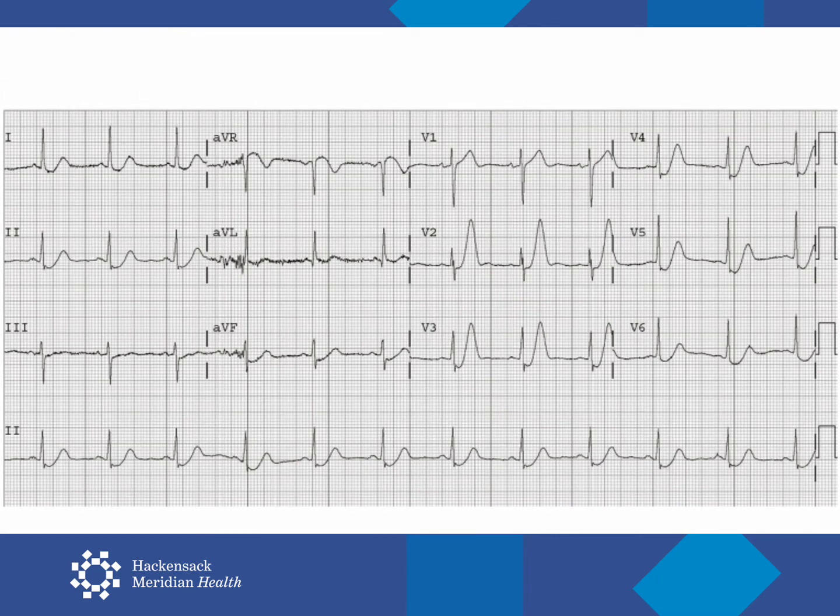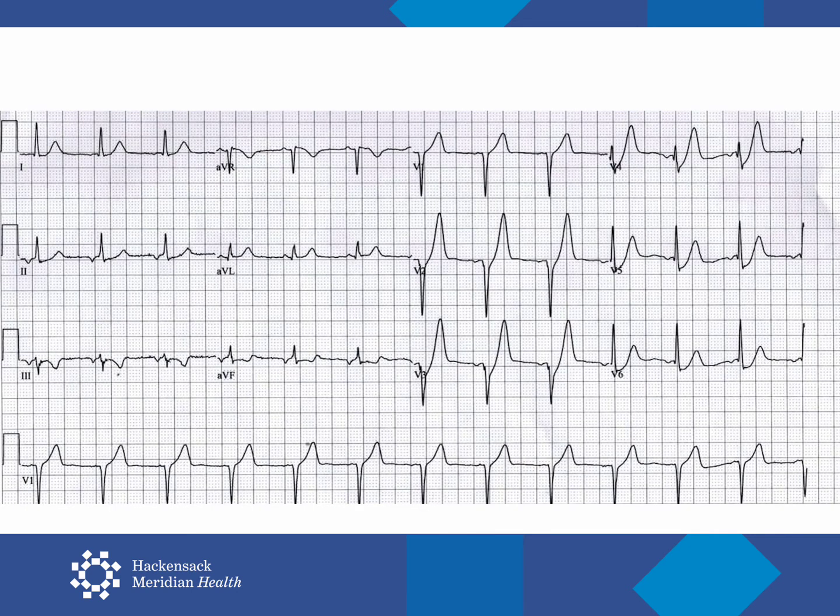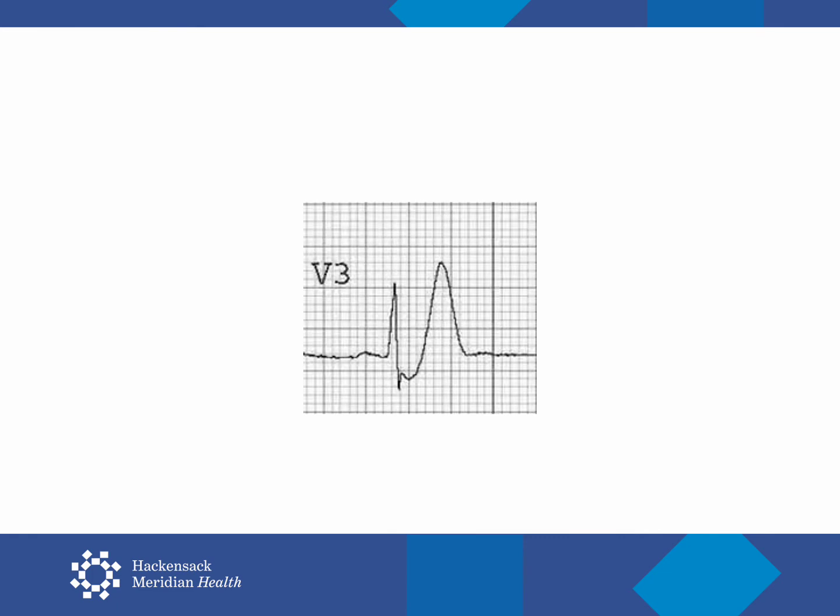This patient presents with sudden severe chest pain. Do you see any elevations in the ST segments? No ST segment elevations? Well, then can this person be placed on observation and treated as an anginal patient? Here is another patient with a similar presentation, and this is a similar tracing. Do you see ST segment elevation? No. Could this patient be put on observation? This is the typical presentation of De Winter sign. The tracing shows an initial ST segment depression followed by a steep, peaked T-wave.